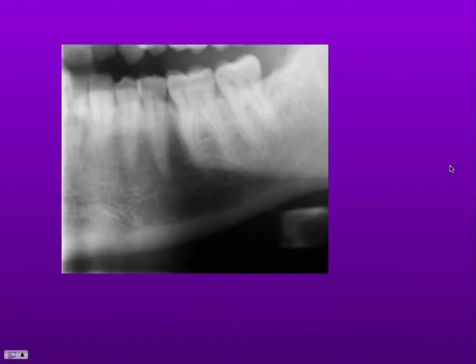Let's have a look at some other abnormalities. In this case, we're looking at the bone, not the teeth. Now, do you notice anything here at all? Well, of course, some teeth erupted. We've got a normal looking jaw with a cortical plate at the lower border. Here's the hyoid bone, which is a normal finding. But do you see this radiopacity here overlying the roots of the teeth?